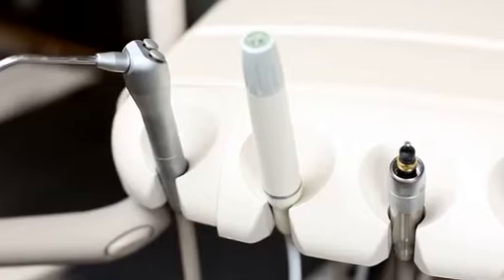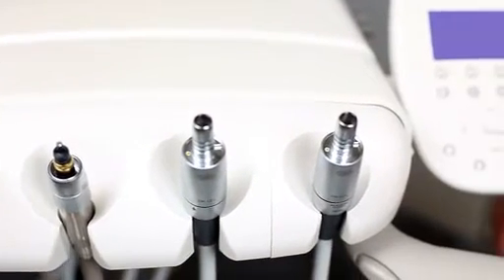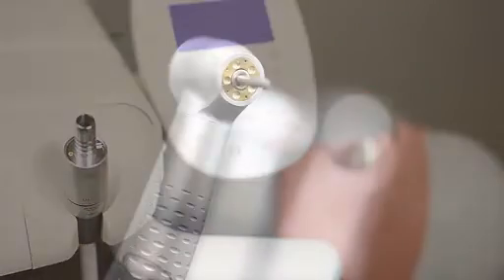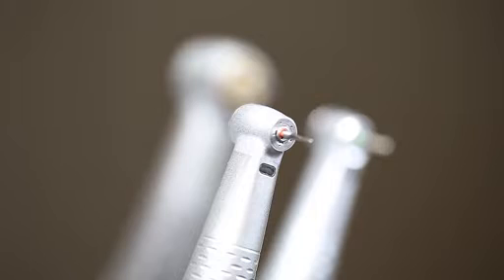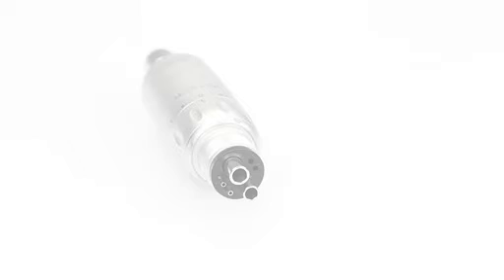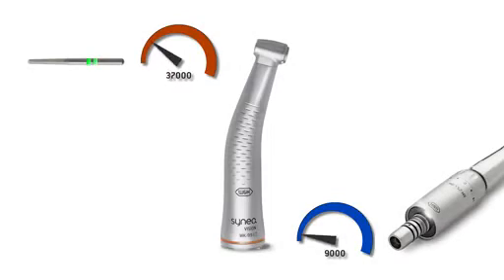Depending on which drive possibilities are available to a dental unit, different possibilities are available to the user for achieving these speeds. At a basic level, we can differentiate between air-driven and electric-driven transmission instruments. Compressed air is used to drive dental turbine handpieces and air motors, which can then power green and blue straight and contra-angle handpieces. Red contra-angle handpieces operate faster than the drive speed.